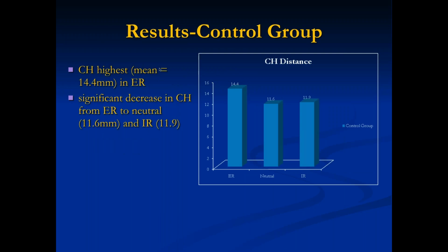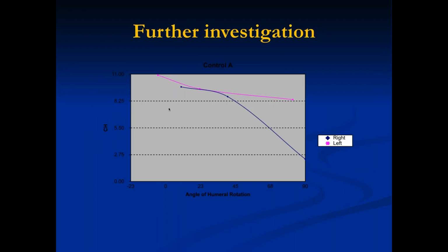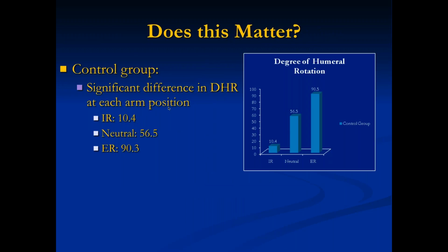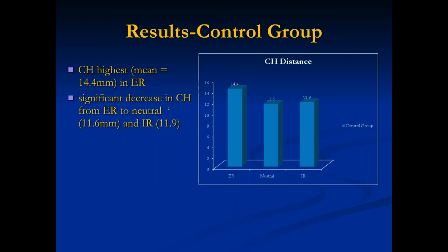Now in the... wait, oops. Well, that's with different degrees of rotation. Okay, here are people where the same person was placed in different positions and rotated.